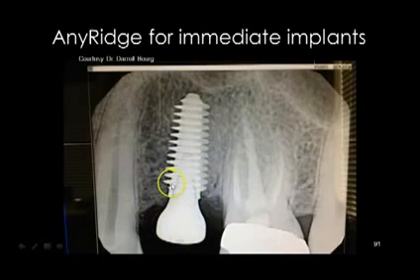Again, look at your wider healing abutment, and look at what we call S-line prosthetics. It starts smaller because of the core and then comes up. And that smallness of the core preserves cortical bone and preserves your tissue, so you not only get an increase of bone, but an increase in tissue. And with that S-line prosthetic, you really get nice, natural emergence profiles of your crowns.